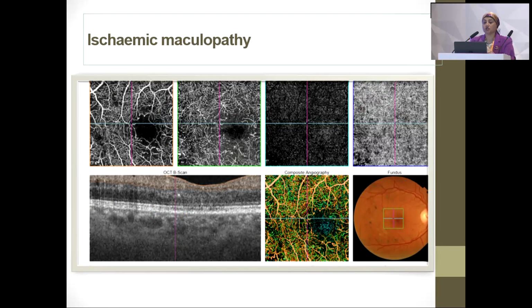Of course, the addition of the technology of the OCT angiogram gives a better visualization and more accurate assessment of the vasculature, and even the segmentation of the layers of the superficial and deep retinal layer with the choriocapillaris. So it compares the three layers of the vasculature in the macular area, not only the overall vascular component of the macular area.